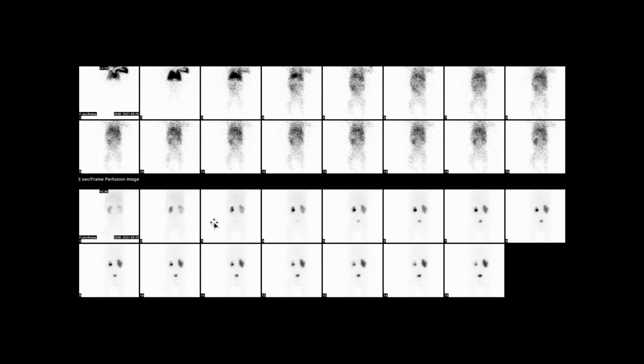As we follow the nephrographic images, we find that the right kidney does produce urine, but the urine is showing a cutoff at the level of the UPJ with proximal stasis.